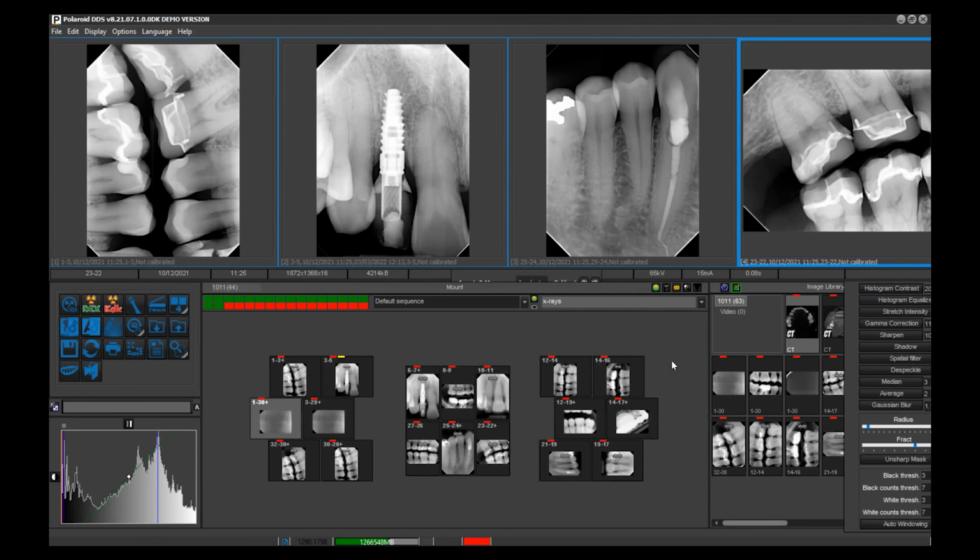With this version of our software, it's probably the most popular and fastest selling software in the world. And it's because of this layout. This is how they often do things in the medical industry. When you open up the patient's images, you see the entire video or photographic history at a glance.